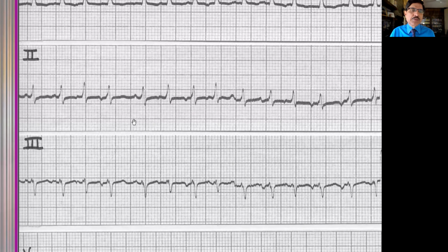There the conduction is 2:1 or 3:1, here the conduction is irregular. Okay, that is the main difference. If it is multifocal, the chances of it ending up in a dangerous arrhythmia are much higher. The irritability, the electrical instability of the atrium, is much higher.